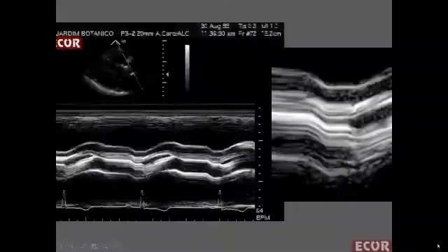If it is calcification, a calcified valve in M-mode echo is very characteristic. It shows several well-defined lines with perfect line borders. It doesn't matter if it is just a tiny calcification. It will have the same aspect of perfect lines with perfectly smooth borders. This is a very important sign. The same thing happens with local thickening of the valve. If it is due to rheumatic or degenerative disease, it will show a single or multiple lines with perfect borders.